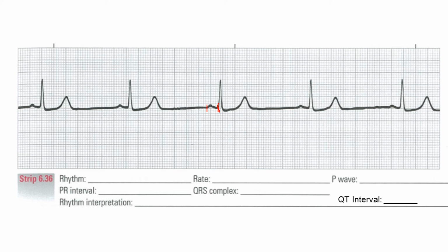All right, so again, before the P, before the QRS, it looks like some of them are about 4.5 to 5 boxes. Okay, measuring your PR intervals. Your QRS, so your measurement is about maybe 2 boxes here. Some of them are a little bit less. Maybe the first one almost looks like just 1 box. So it's about 0.04 to 0.08, all within normals.